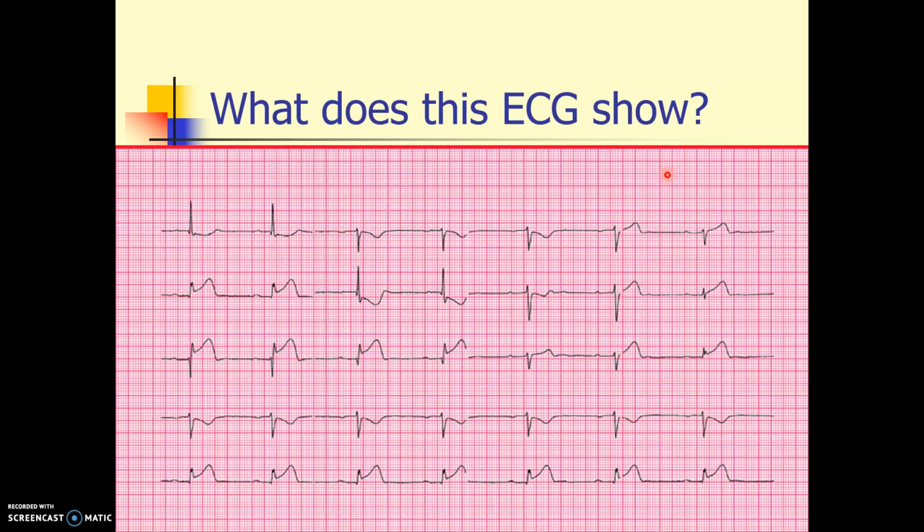What about this one? For each of these, I just want you to pause the video, have a look at the ECG, and then make a determination. And then you can continue the video and hear what I have to say.